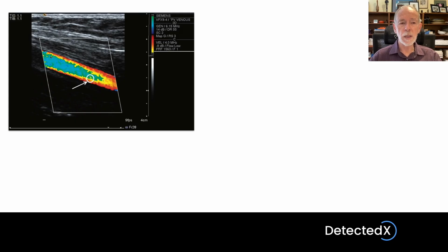It is possible sometimes to have areas within a vessel where the flow is going in the opposite direction. But in that case, the velocity is going to be low. So we would have an area of red and then probably an area of black, and then adjacent to that, an area of dark blue. So we'd have dark red, black, dark blue. That would be a genuine flow reversal. But jumping from the maximum in one direction to the maximum in the other direction must be aliasing.